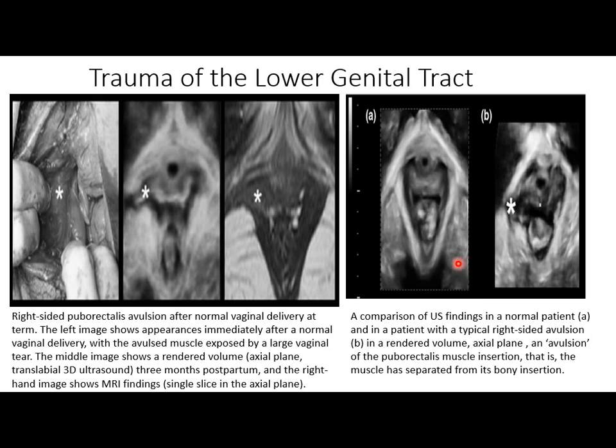This is a 3D ultrasound, yes. This is normal, and there's avulsion. This is the hypoechoic area, the normal puborectalis muscle. There is avulsion of it. So during avulsion or tearing of these muscles, this leads to a collection of blood within the paravaginal area.